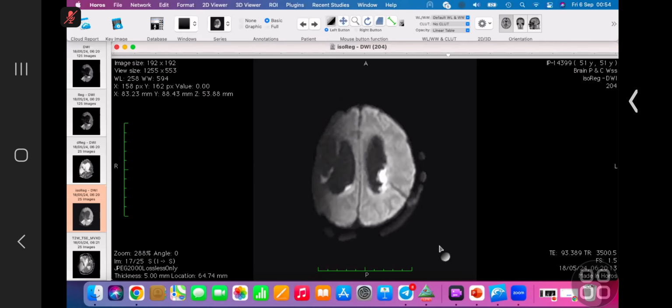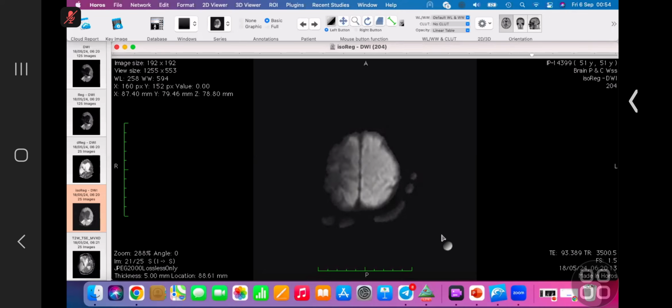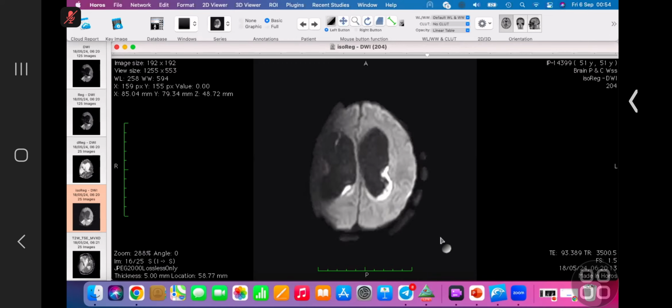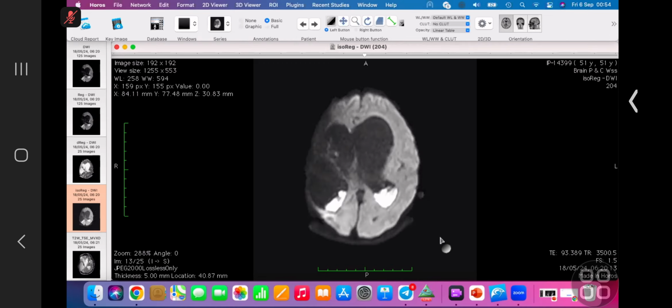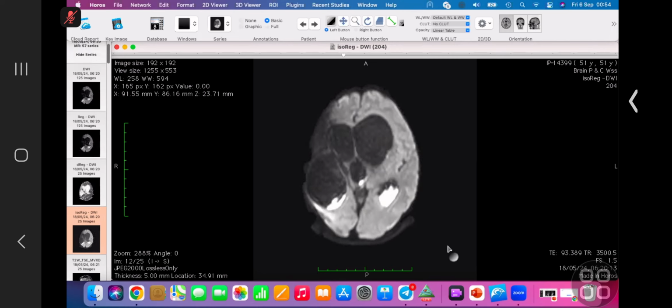You told me the patient has a VP shunt. There is also an area, I think, of encephalomalacia, maybe related to previous cerebromalacia, with porencephaly, maybe related to previous intervention or trauma, or perinatal insult. Do you want to see the ADC?